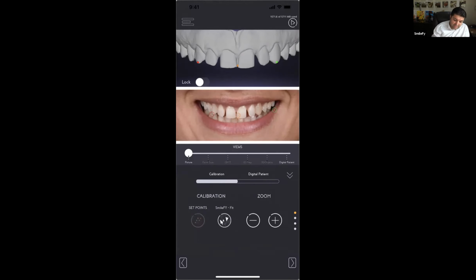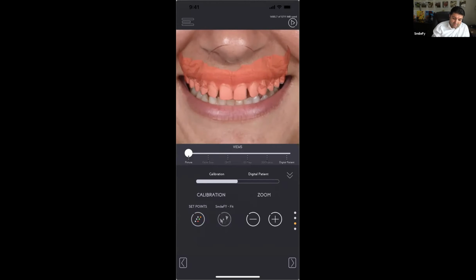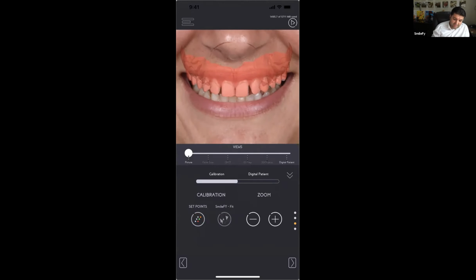And I have to set the same 3 points on the picture. Okay, so in the same order. That's important. Otherwise, when the points are not in the same order, then the calibration is going to be upside down or completely different. So let's see if my points are accurate enough. Oh yeah, it's better than I have expected.